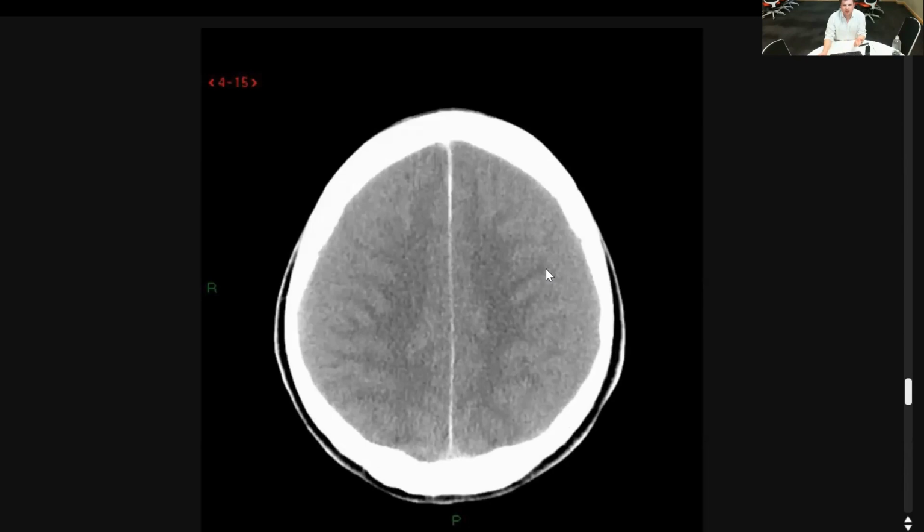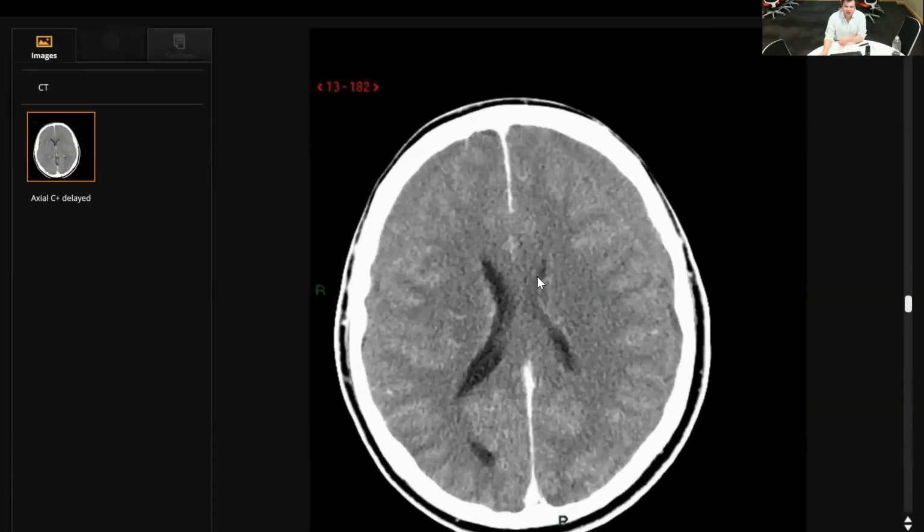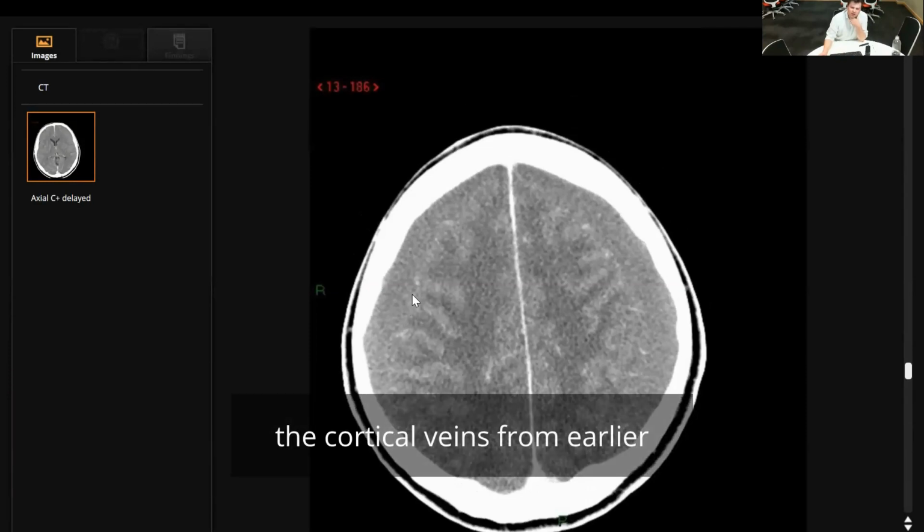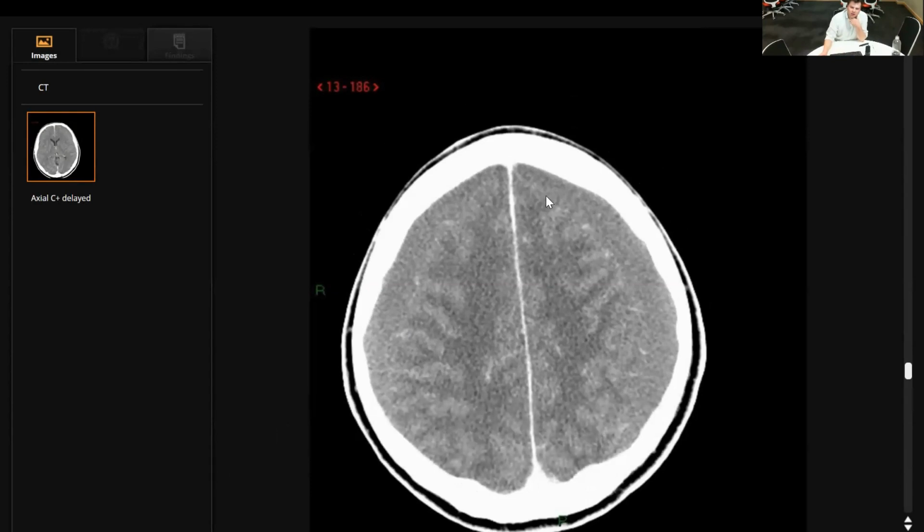Yeah. And remember our chat, we were saying that the gyri have to come right out to the skull edge. So actually we can see that's stopping there. The guys gave contrast for this case as well, and we can see these are the little pial vessels. So this is the brain here, and this is something crescentic on both sides. So what do you think this is? So this is just a massive subdural.